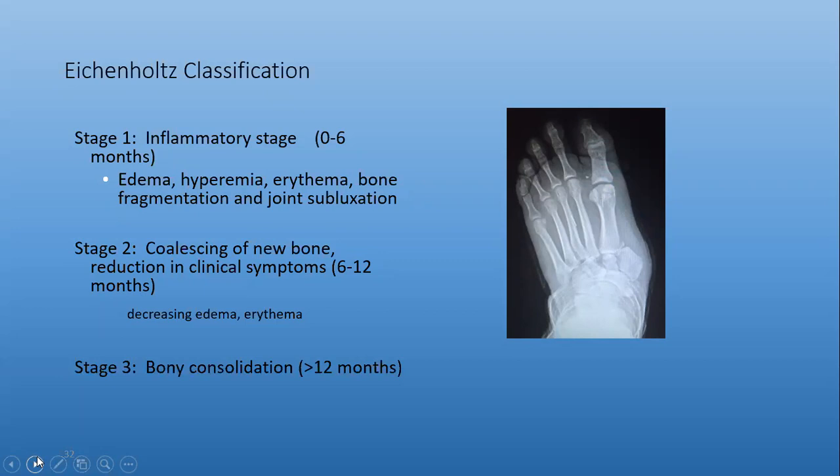I think, is it B1 or sorry, A1? Yeah, if this was trauma related. So in your read, you would describe it as homolateral because everything's moving as one unit and not divergent. So homolateral, lateral deviation, and then kind of tough, but I would just say the tarsal bones show a lot of destruction, debris, and it's pretty disorganized. Significant deformity of the tarsal bones.